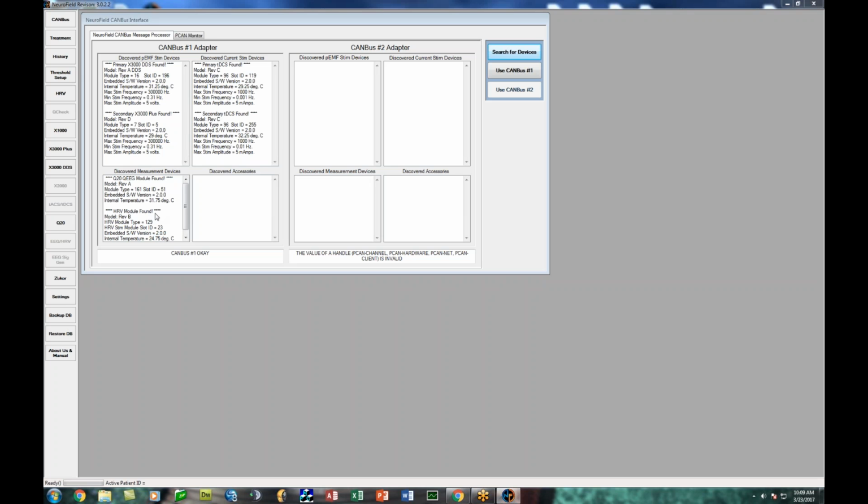When you see all this, this is just like the other program, the indicator to show that things are turned on and plugged in correctly. If you turn on the program and you don't see the unit get displayed here, that means either it's not turned on right, or the driver's not installed, or the battery's dead, or not in, or the unit isn't on.